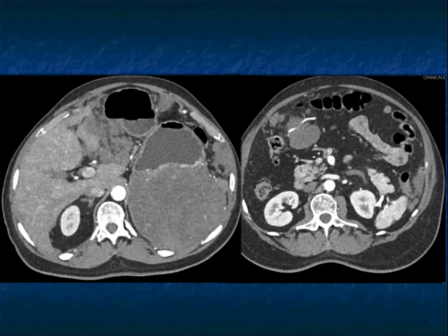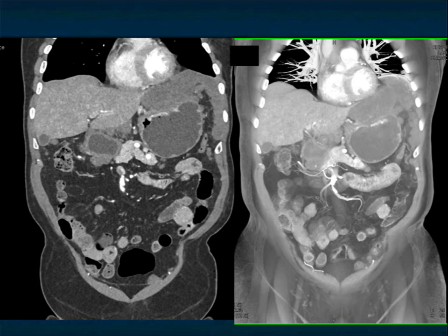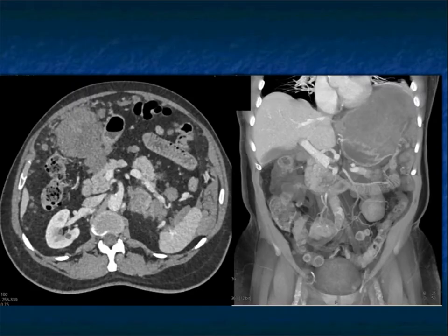And here's more implants both in the mesentery and in the omentum. So when these lesions typically rupture, they will get this spread and can be anywhere. So again, one of the reasons why you need to resect these, why you need to treat them when they're smaller before they rupture and then cause this incredible seeding. Once you have seeding, chemotherapy doesn't do a really good job. Gleevec can be helpful with longer survival, but once it ruptures, you really have significant problems.